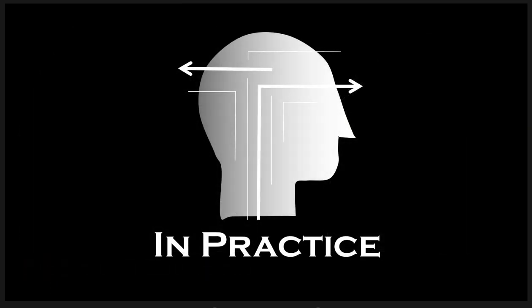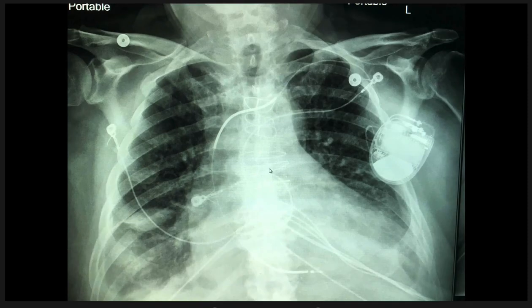Take a look at a real case of this. So, sure enough, there it is. It's got sort of that lentiform appearance, and you'll notice sort of the gray opacity there below it where this is seen in the setting of an effusion. Some people will actually call this a pseudotumor.